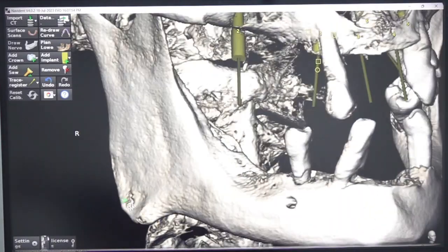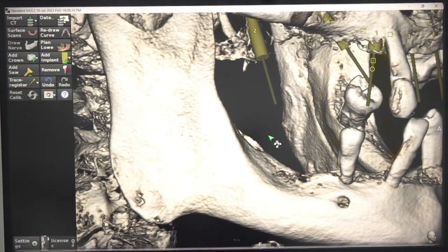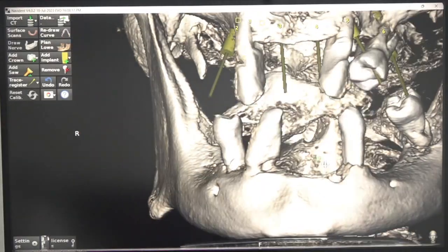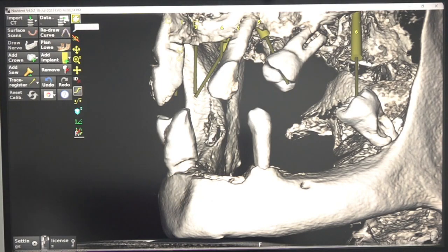this projection, this angle. So what this means is there is severe masseter muscle activity. Patient must be a heavy chewer or bruxer. So heavy force will be generated. The patient most probably will have a low face, low angle, which means the patient will generate heavy force. So definitely a night guard should be given, and a soft diet should be advised.